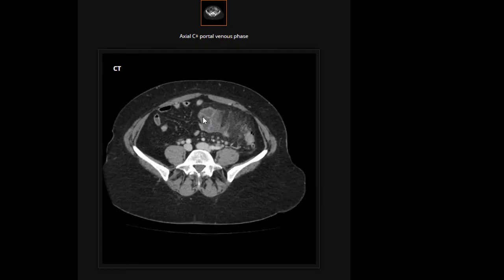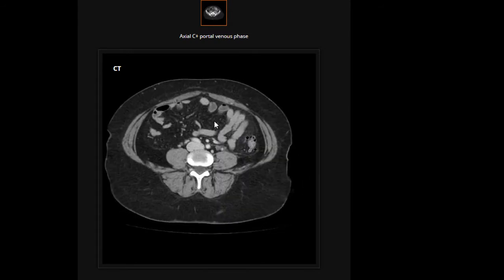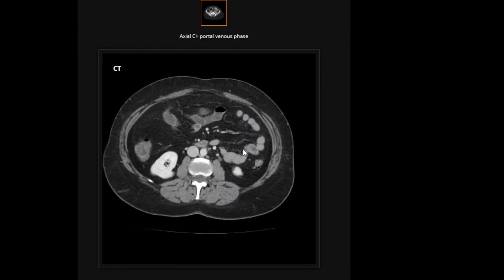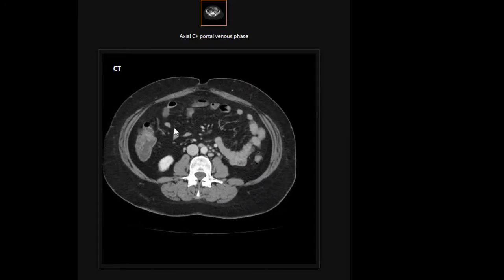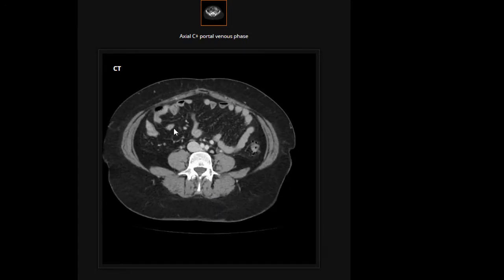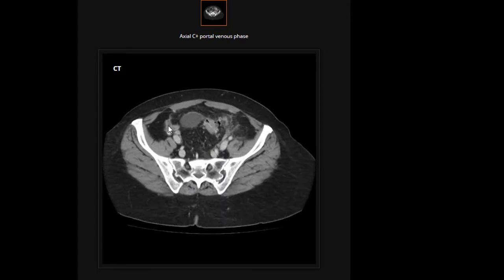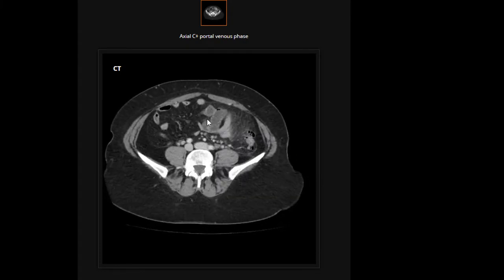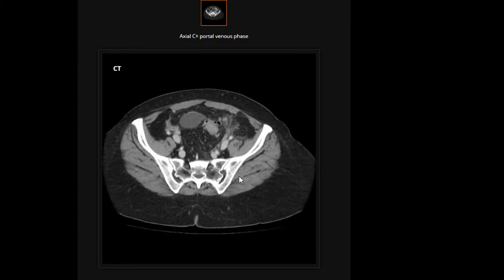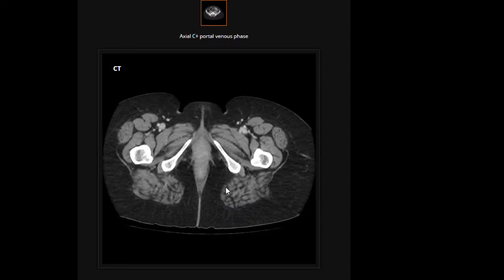There is this short focal segment that is fluid filled, a little abnormal compared to the density of the rest of the small bowel, and we'll look on the right. And again, a little bit more fluid-filled small bowel, not particularly abnormal, but given all these inflammatory changes, it might be related. So small bowel is possibly with some reactive change.